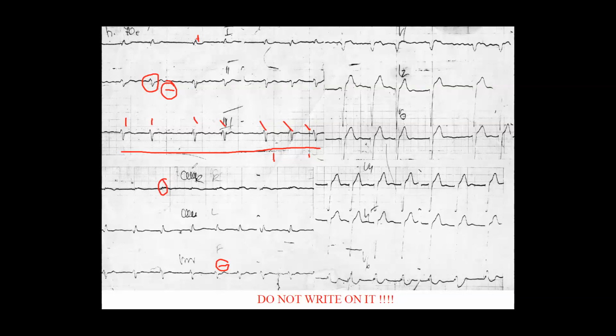Which is the next one? Do we do the QRS complex to see if... No. This is why I will send you my scheme for how you should go through the ECG. I would start with the P wave all the time, then PR interval, QRS, and usually I like the evaluation of the axis when we are talking about the QRS complex because you are evaluating and you won't forget anything.